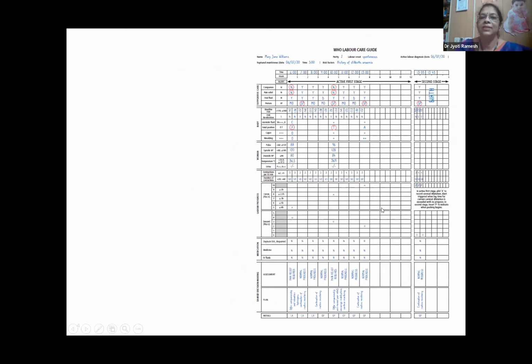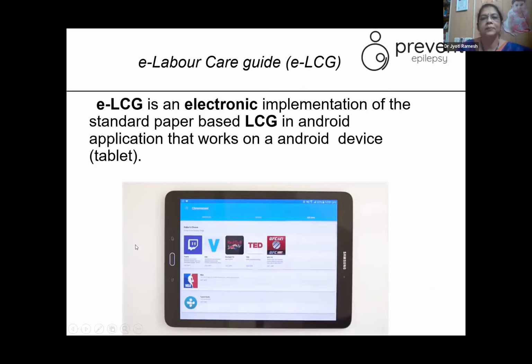And you will see that certain red marks are there. They are the alert marks, and they are shown in this column. So whenever any alert comes, this will be marked red, which will help us to identify the alerts.